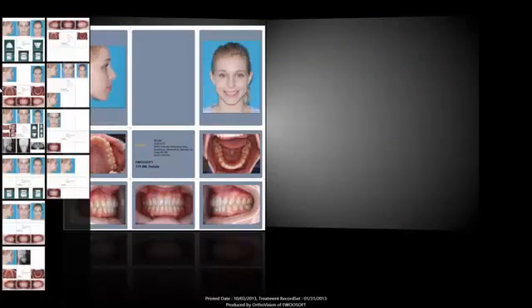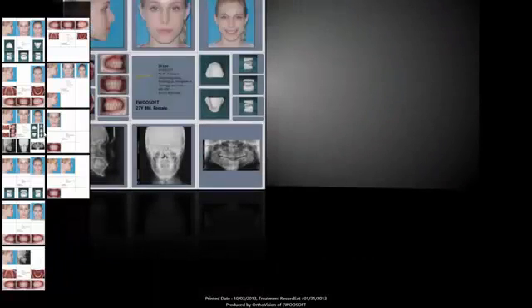Another feature of OrthoVision's gallery mode is, when we move our mouse to the left side, we'll see all of our pre-designed slides laid out for you. You can select them from this menu by simply left-clicking on a thumbnail.